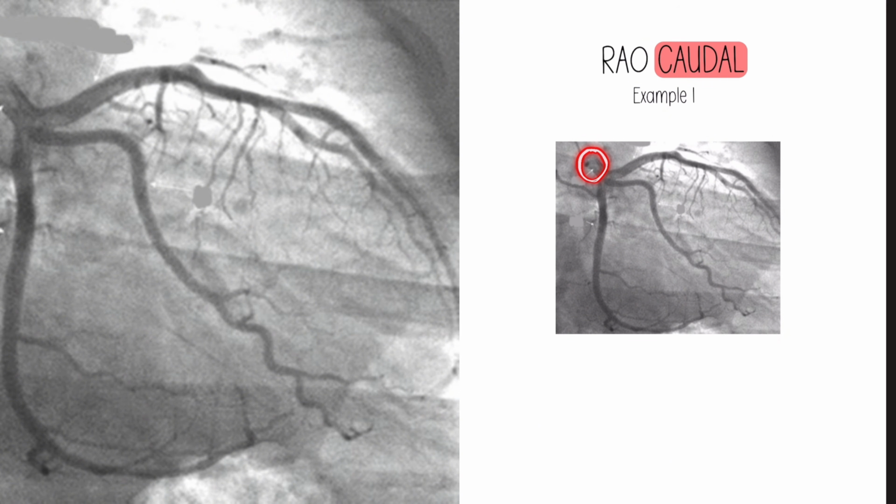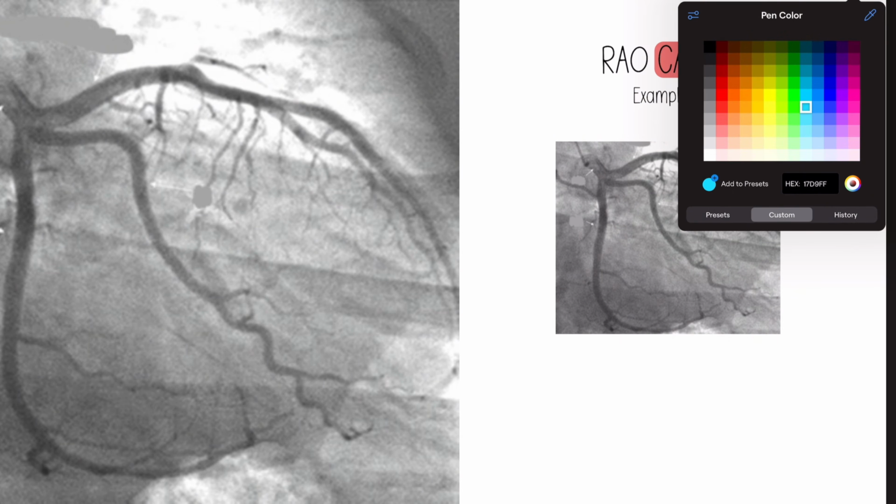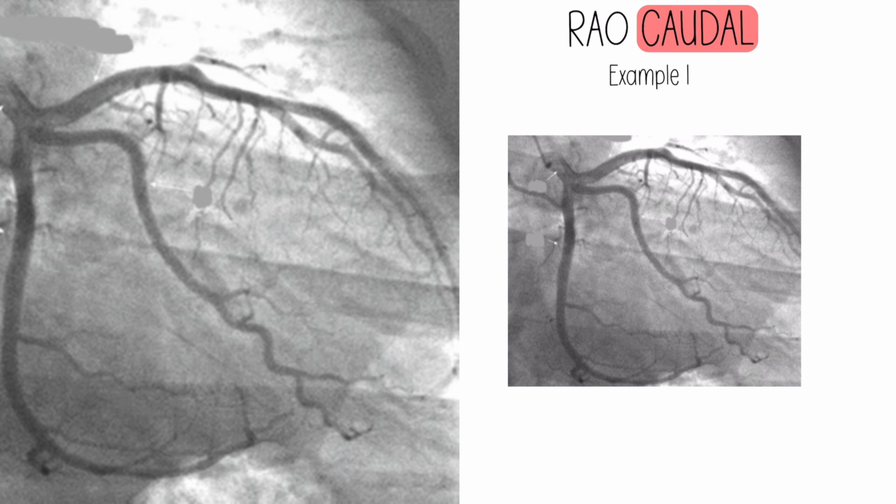And I did forget earlier to identify the left main. So again, we will go ahead and actually label these. And remember, this is diag, questionable LAD. Sorry, let's do red. Red's a little easier to see. Diag or LAD. We have these hairs coming over here. Those are the septal perforators. This is proximal, possible mid, distal is out of the image.